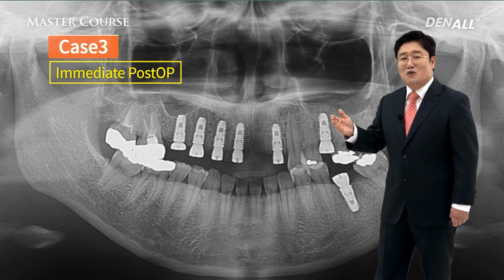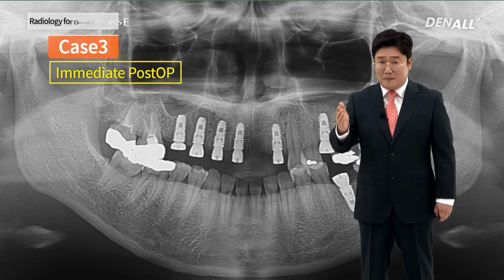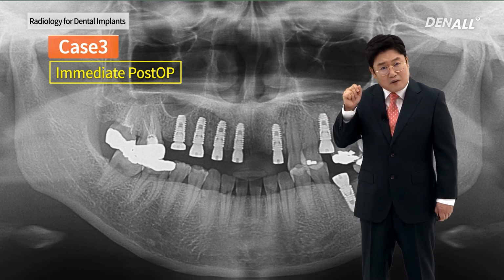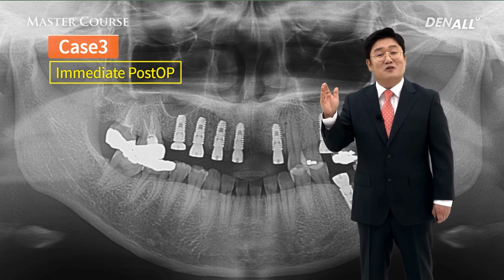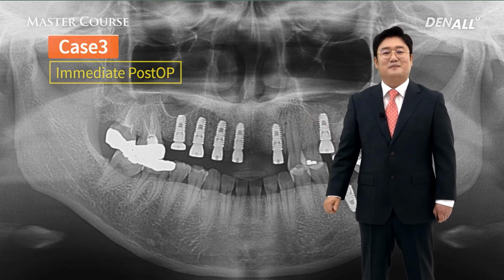In the past, panorama radiology, X-ray template, or radiologic template, guide or stent, whatever the name is, after removing the metal rods, surgical template, surgical guide, or surgical stent was used like this, absolutely necessary to use it. So I wanted to show you this.